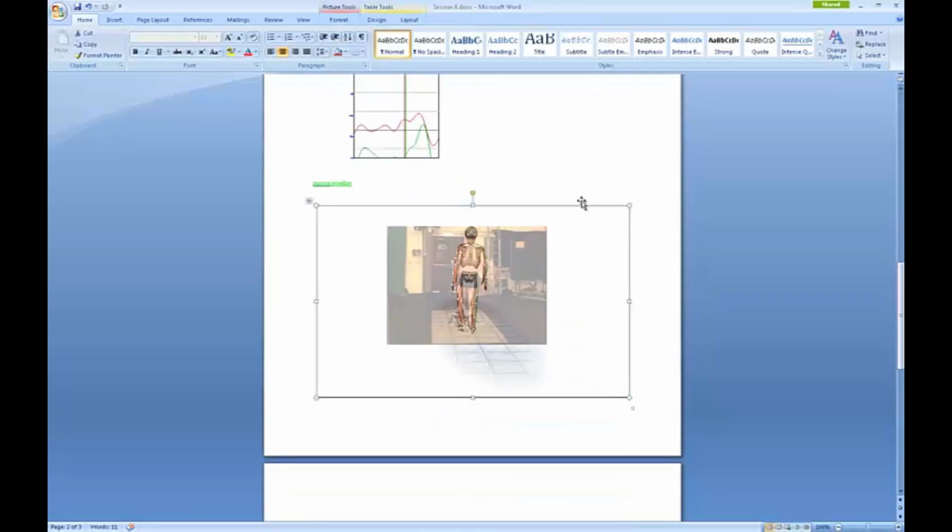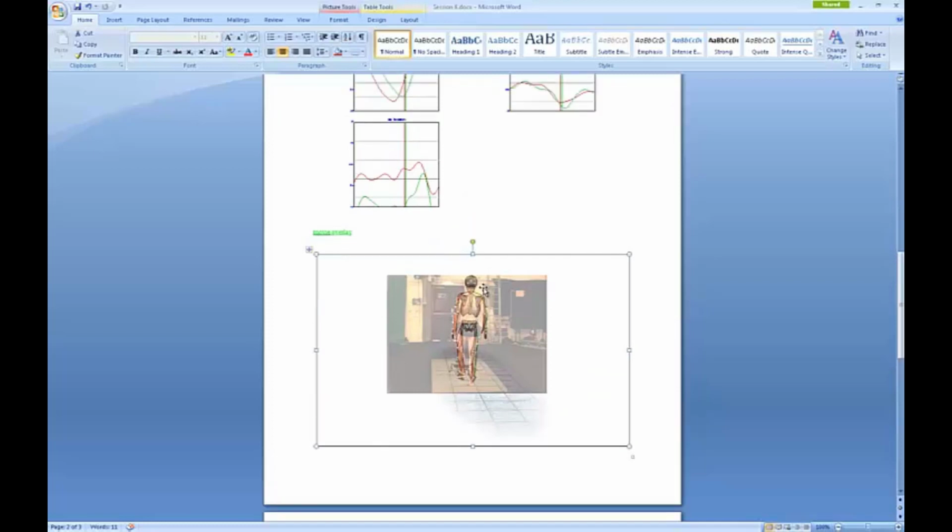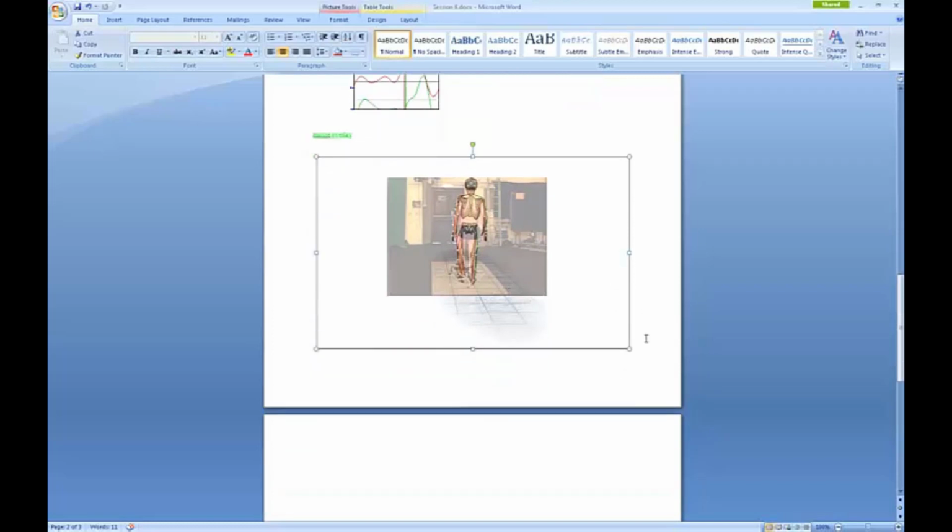This is the one you'll notice that the background went from black to white. And it's a little hard to see because I've got the overlay with the sticks. But as you start those exports, you can get familiar with the options that make your reports the easiest to read. Go ahead and close that.